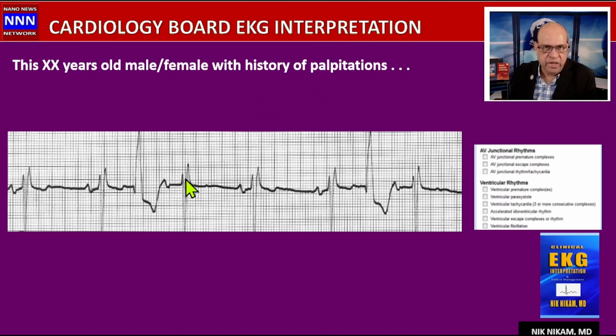The same thing happens with atrial premature beats, but the compensatory pause is much shorter with atrial premature beats compared to ventricular premature beats. However, occasionally we have a premature ventricular beat which fails to reset the refractory period of the sinus node. As a result, the next beat just comes on time. That's all we need to know as far as this is concerned.